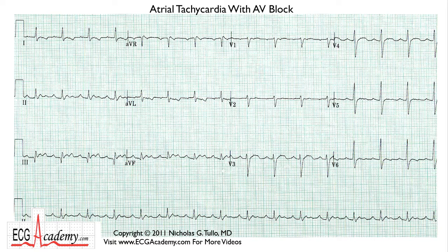The last one I want to show you is another 12 lead, and it's very deceptive because when you first start to look at the QRS complexes, you see that they are clearly regular. They're kind of marching on through. And when you look at lead 2, you'd say, this looks like a nice P wave here. And it almost looks like just sinus rhythm with a first degree AV block because the PR is about maybe 260 milliseconds long. You'd say, okay, no big deal, sinus rhythm, first degree AV block. And in fact, the cardiologist who read this ECG called it just that.